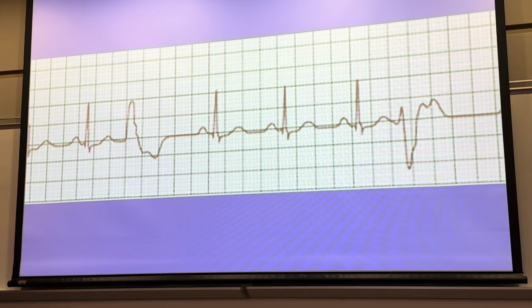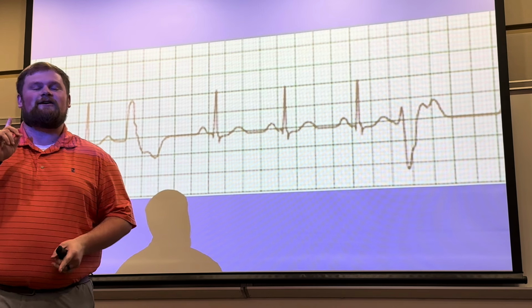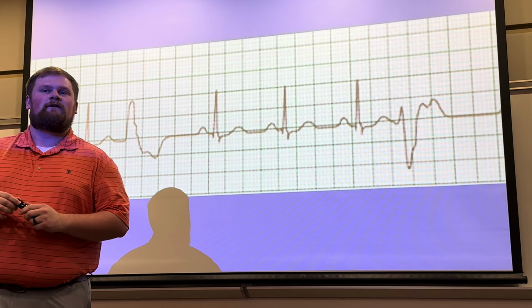Or I can ask Haley. I'm gonna ask Haley. Please. Haley, what do we have right here? They are PVCs, okay? What kind of PVCs? No, there's two different ways to or no? Close. You're in the right path. So they are pointing in different directions. There's another term for it.